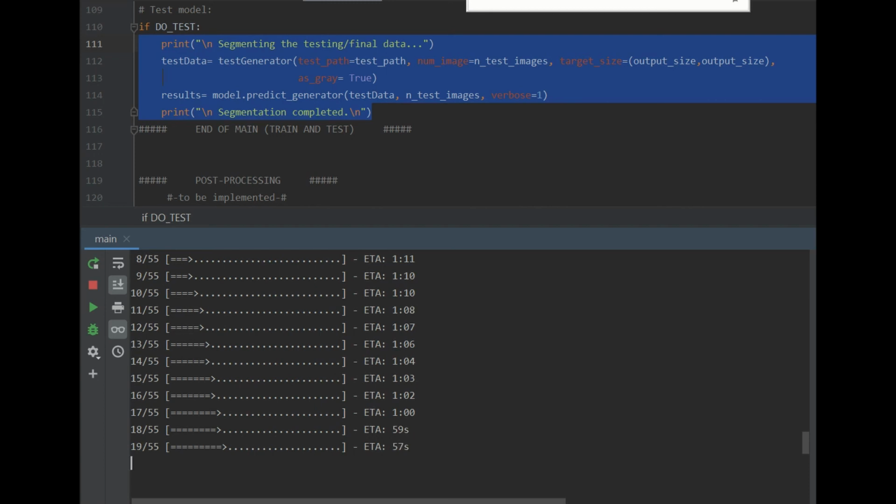And then we will try to check the results and see if the accuracy is more or less correct, or at least if the segmentation with the UNet is similar to a segmentation that we already have performed manually. That is going to be our gold standard.